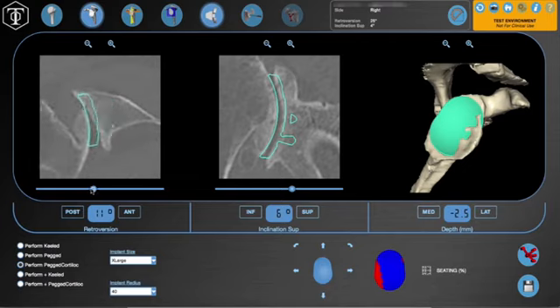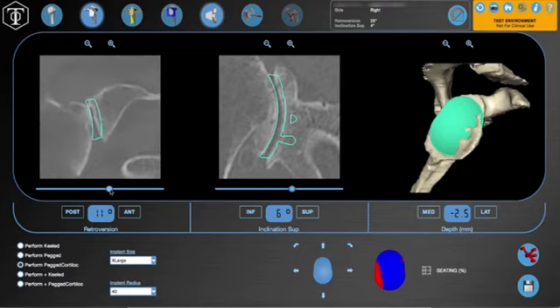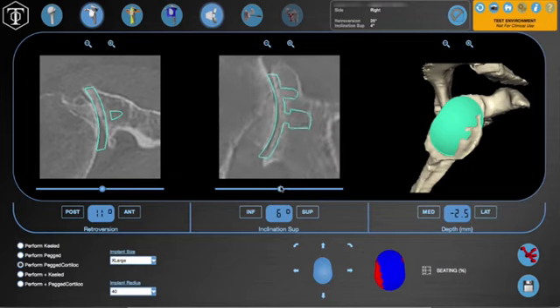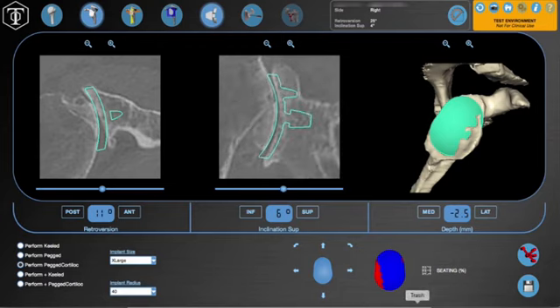And as I'm scanning on the left, you could see from the axial cuts, just to have the glenoid be seated posteriorly, we'd have to ream into all of this subchondral bone anteriorly. So I think that in this case, if we're going to really try to correct our acquired retroversion, using an augmented glenoid is probably one of the best and safest ways to minimize any violation of the subchondral plate. So even though the inclination seems to be spot on, you could see here that as we're reaming into the glenoid, to be able to seat this glenoid where we want it to, we're going to have to violate at least 50%, probably more, of the subchondral plate to get upwards of 80% or more of seating, which is something that I typically try to achieve: 80% or more.